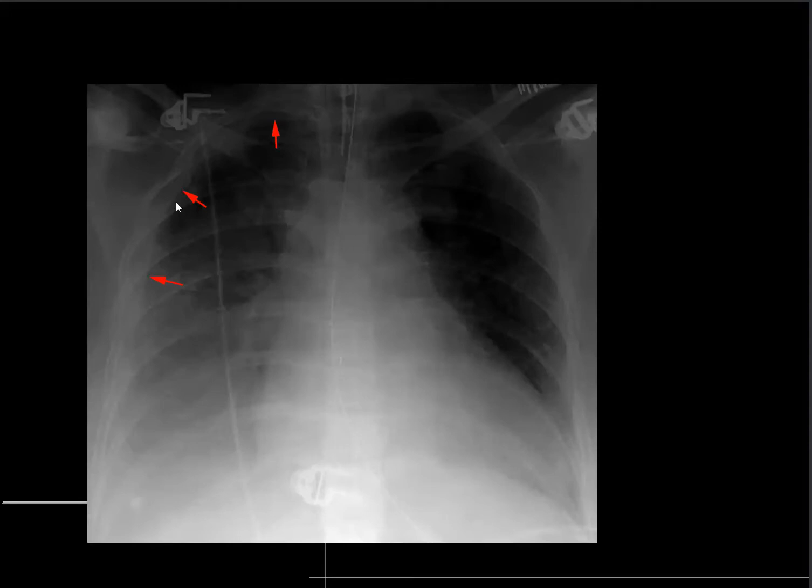This is a lateral pleural effusion. You can see there is this line here with density outside, and that's just fluid within the lateral pleural space pushing the lung inwards, and the lung is the more translucent or darker area. The right hemidiaphragm is no longer visualized because you've got pleural fluid around it.